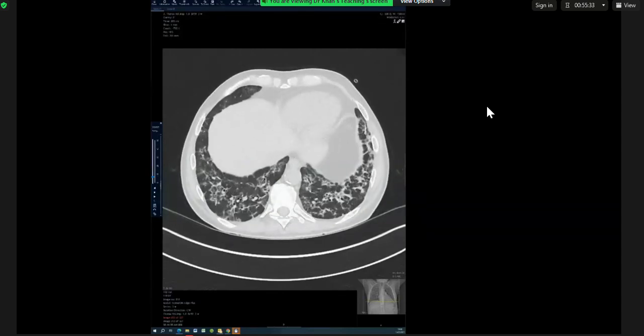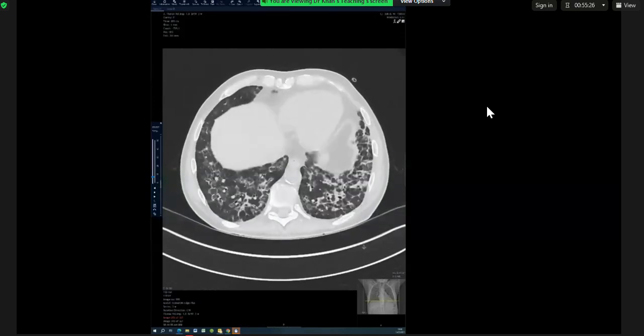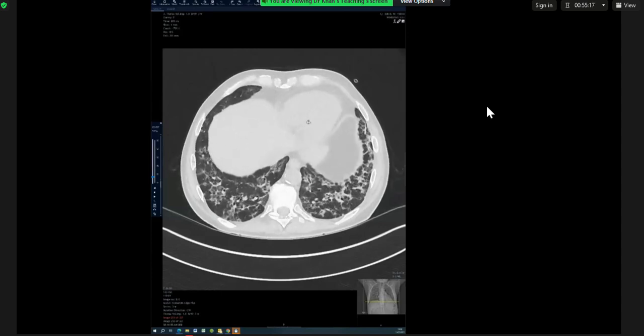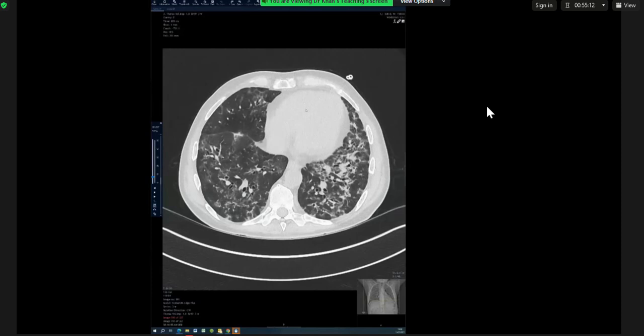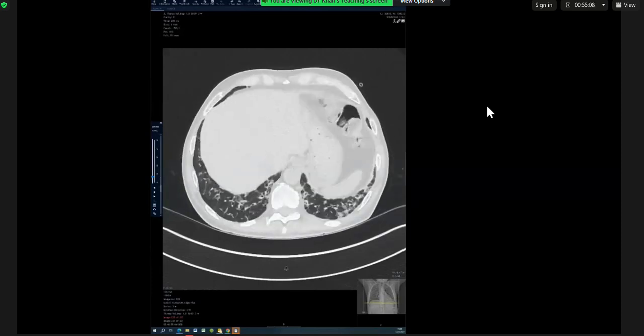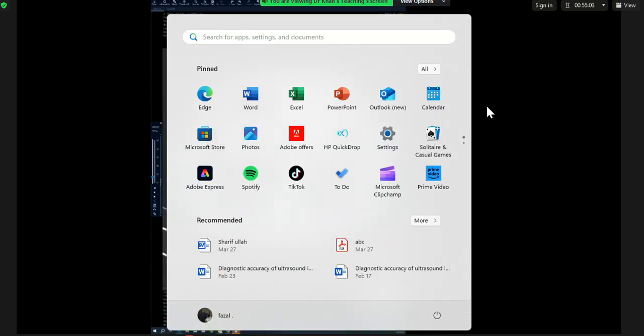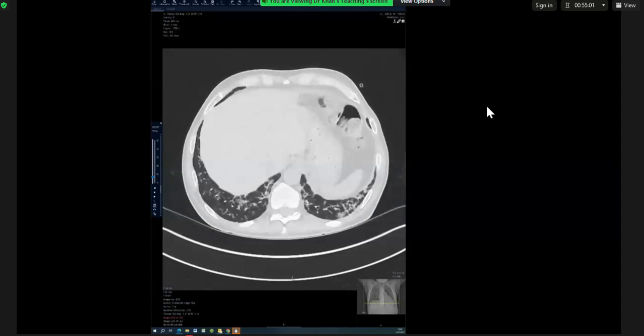You want consolidation. You want, like you said, peripheral consolidation, almost triangular looking areas and all that. This is a pneumonitic process. It is an interstitial process. It is caused by something. You went down the right line. You asked me for the history, and then you said history of smoking. If smoking caused this, nobody would be a smoker. So sadly, smoking gives us DIP and RB-ILD, but this is not the appearance for that.